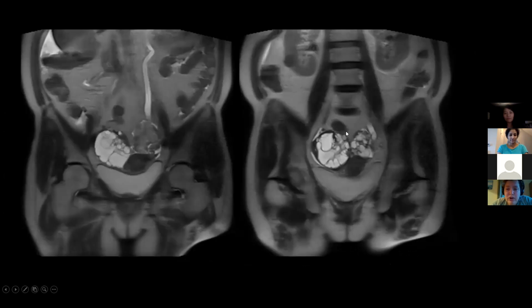Here are just a few more images of the pelvis. So, bilateral ovarian masses, there is definitely a lot of soft tissue on the left, and there is a left-sided hydro. So we can vote at this point.